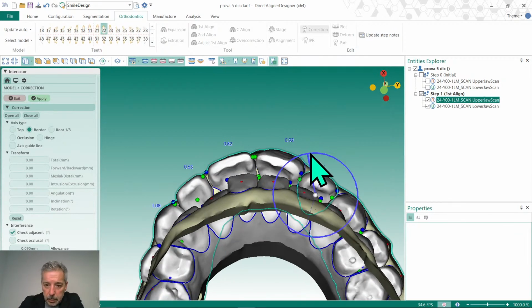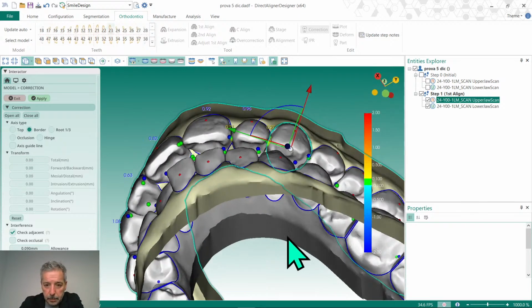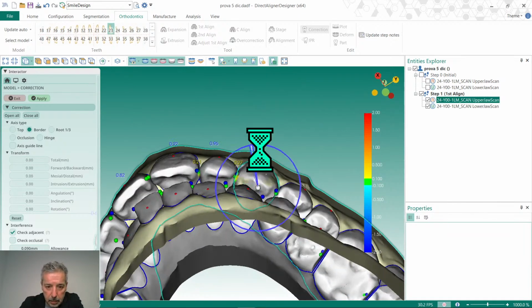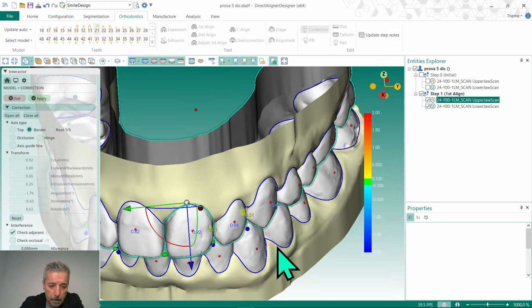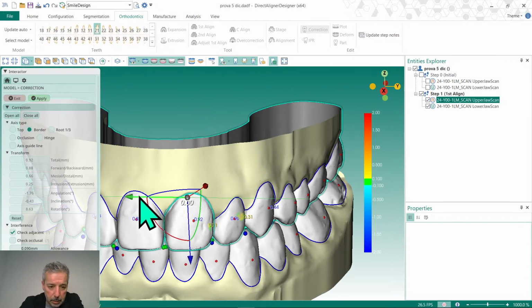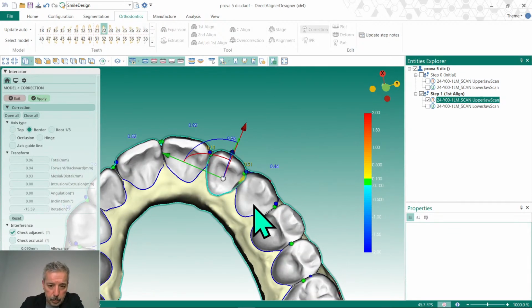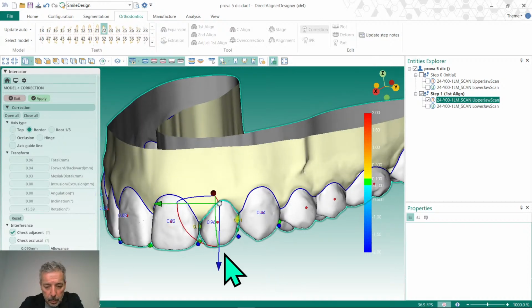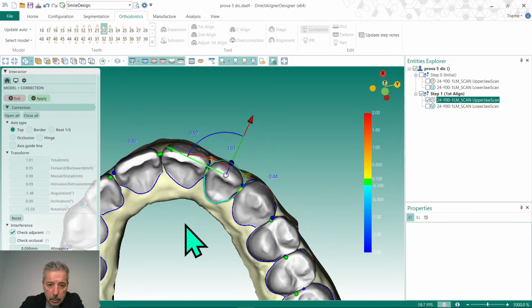Now we can make rotation in the lateral, and okay, you have collision. Now we check collision, and okay, we can move something like this one, and you go like this. And maybe the border again, just to move like this, and to go, for example, like this, just to take off the collision. Okay, not a lot of collision.